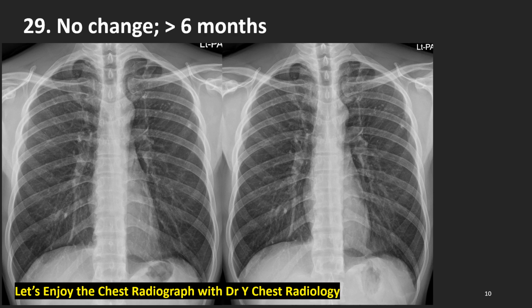How about this young man? No change for more than 6 months. Let's look closely.